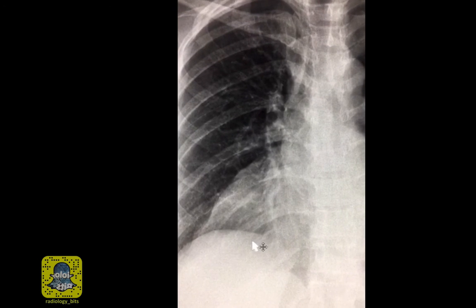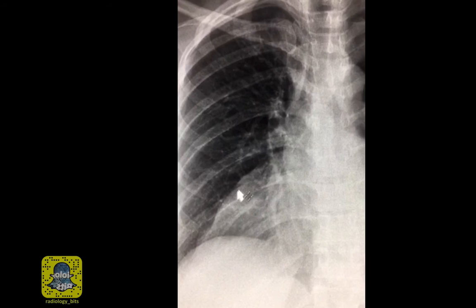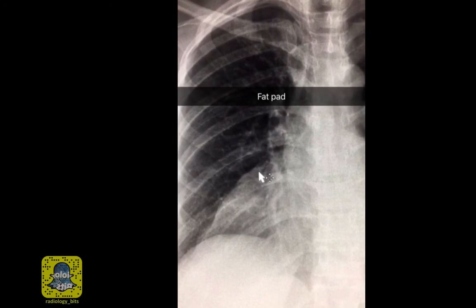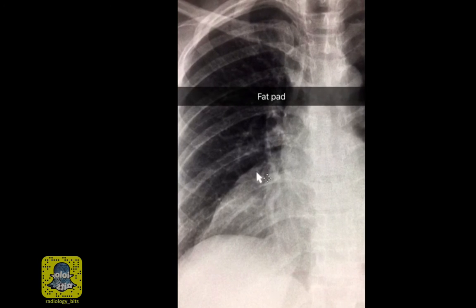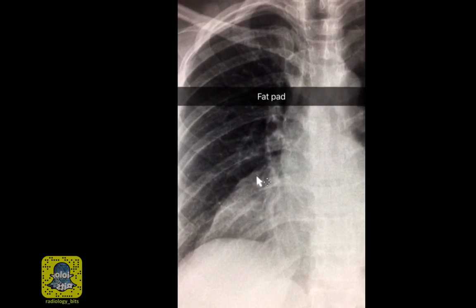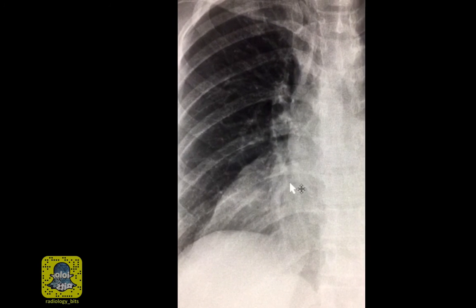This is a relatively common finding in chest imaging, and the differential diagnosis for such a finding is very classic. The differential diagnosis for a right cardiophrenic angle lesion includes a pericardial fat pad, which could have various densities on a chest radiograph depending on many patient or chest X-ray technical factors.